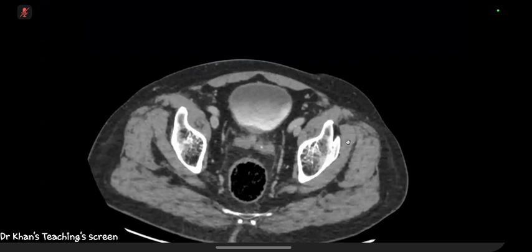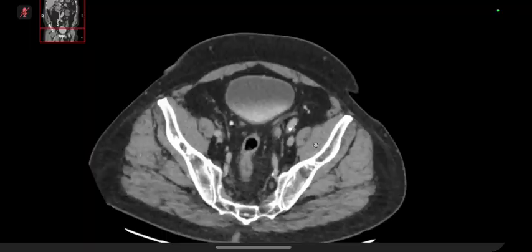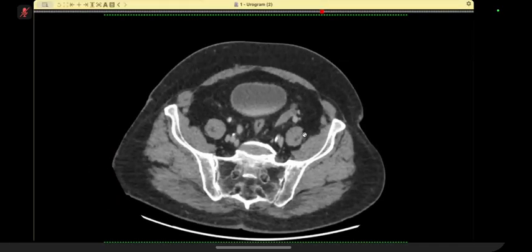So you said it is enhancing. Can it be high density? How can you confirm that? Yeah, it can be high density also. I'll have to look at the plain sections. If this is high density, then this could be a blood clot as well. But that won't be this long standing, I think.